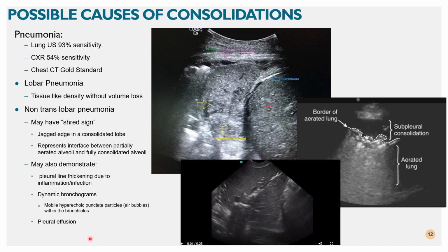And then finally, if this goes on long enough, it's going to turn typically into a pleural effusion, which we'd easily identify. Here's a small pleural effusion, where a little bit of fluid is going to have that anechoic appearance.